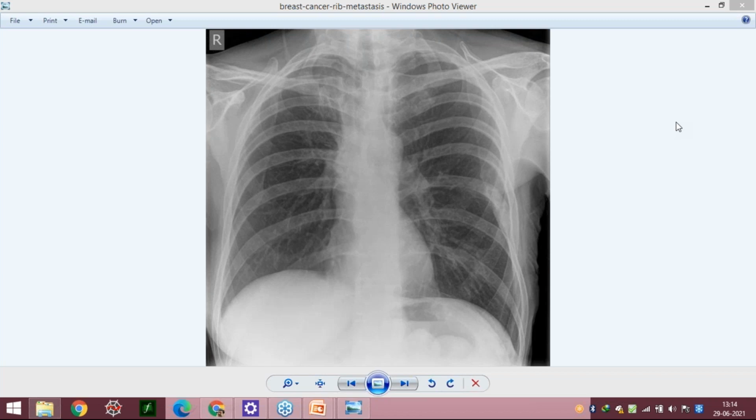We cannot comment on the cardiothoracic ratio in the AP view. We should not be idly commenting. However, if there is gross cardiomegaly, it would be quite obvious. I hope now the cursor is visible. Okay, if I count, yeah, so this is one lesion, this is another lesion.